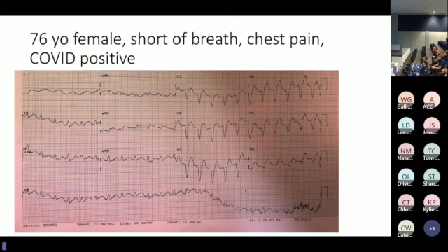Looks to me like they have left bundle, which may or may not be new, but aVL looks like there's ST elevation there, so I'd be concerned for an LAD or LMCA. Yeah, and what else might you think of in this COVID patient? I mean, PE, but given it doesn't fit with anything except the tachycardia, myocarditis is the other thing.